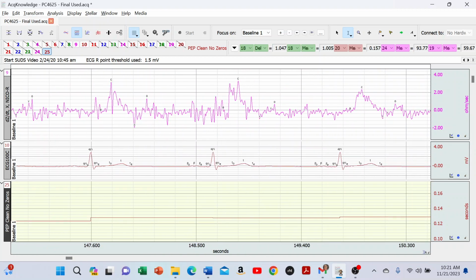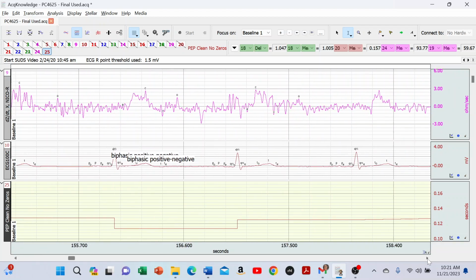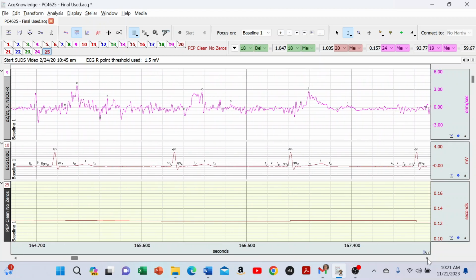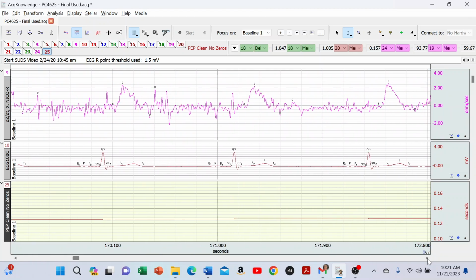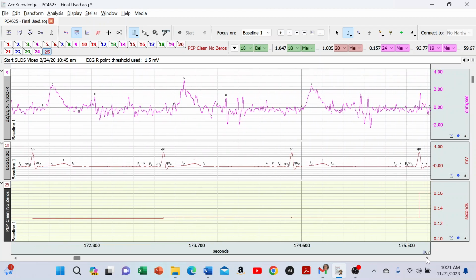And you can see all along the way, the O of the QRS onset is perfectly in the notch where it should be, and it's got a well-behaved PEP signal. We have a nice clean sequence here, but it's going to take a while to get to the next problem. Every time you stop, clean onset, clean PEP value, over and over again.